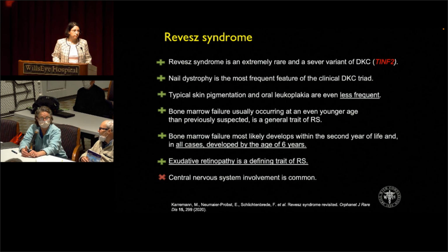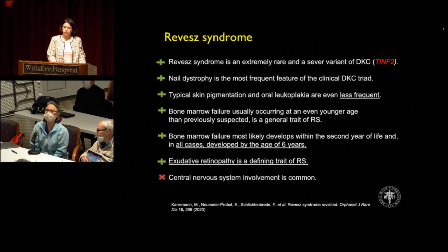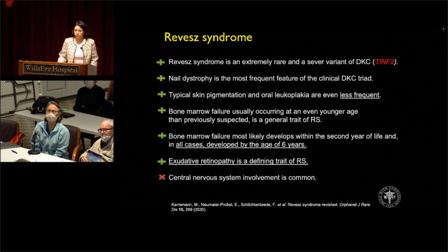So when you see what looks like FEVR, just keep in the back of your head, could this be a telomere shortening condition? And when you look at the fluorescein, maybe you can just go to the fluorescein there, that's a nice segue.